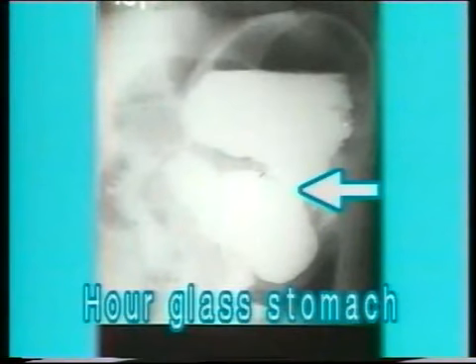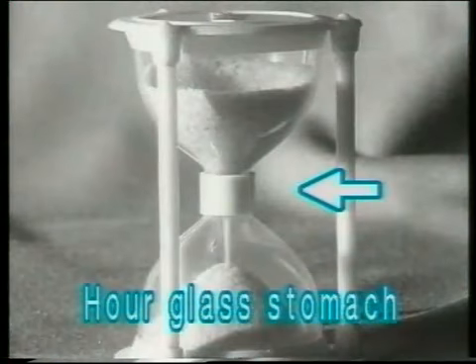A long-standing gastric ulcer on lesser curvature with cicatrization may cause narrowing of the gastric lumen, and in an extreme case, it narrows down to divide the stomach in the shape of an hourglass. This is an hourglass stomach, with a narrow center, a pouch above and a pouch below.